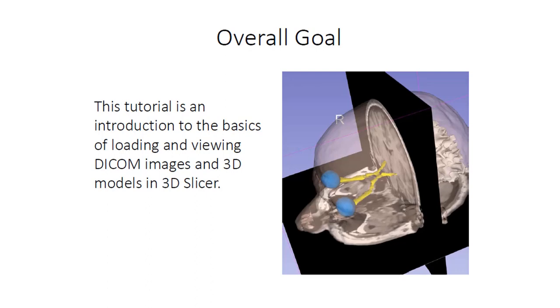This demonstration serves as an introduction to basics of data loading and viewing DICOM images and 3D models in 3D Slicer. DICOM is the standard for the communication and management of medical imaging information and related data. DICOM stands for Digital Imaging and Communications in Medicine.